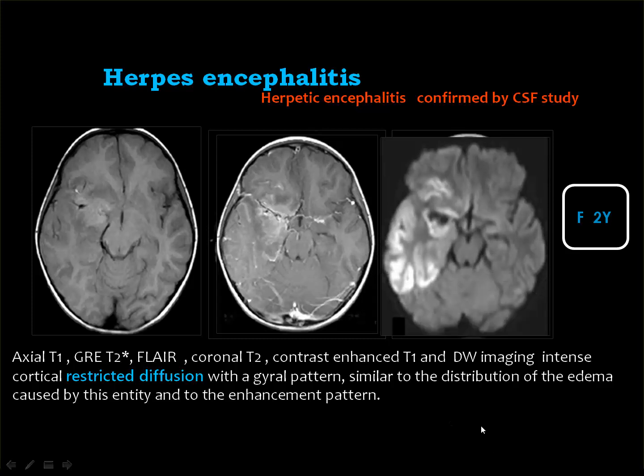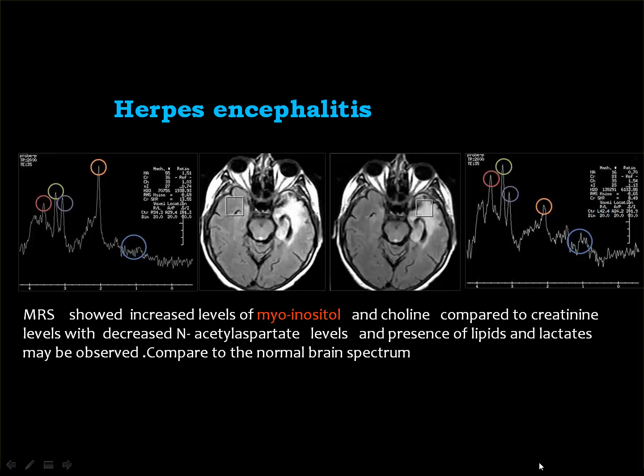Encephalitis may bleed sometimes. If you inject a contrast material, you see this appearance, but in the diffusion weighted images you see the restricted diffusion.